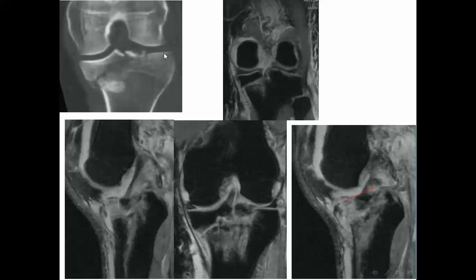In this one we have a fracture of the tibial plateau, and you have here in the MRI the same, and that one is showing bone edema, and this one appears to be abnormal, and this is the retracted part. That means that there is a partial ACL tear. Some of the fibers are there, and some of the fibers are retracted, and here is the bone edema with the fracture of the tibial plateau.